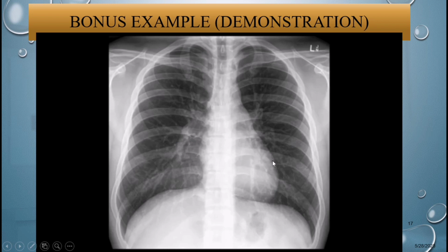So if it's not going towards this, it means that it's not enlarged. But if you have a cardiac shadow where your first finger is here, then the other one is this side. Then if you put your finger this side, you find that the other one is going to reach this side, it's crossing the other lung side. Then you know, okay, that's big. But otherwise, clinically, you can even just tell, okay, this is cardiomegaly. Otherwise, but okay, this is the X-ray we have here.